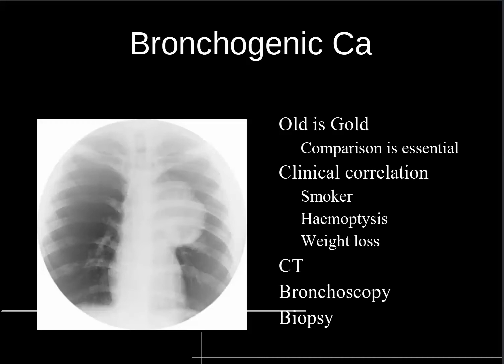Correlate clinically. Smoking, hemoptysis, has there been weight loss? If you see this, you have to confirm it with a CT, and then you've got to get a sample of cells for the histopathologist to analyze, confirm your diagnosis, and tailor appropriate treatment. And biopsy can be done via bronchoscopy or CT, and radiologists do CT-guided biopsies of lung lesions.